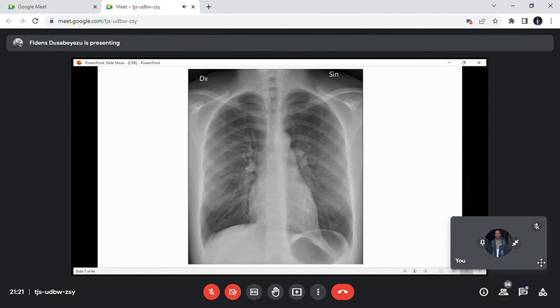So those are what we look at in the lungs. You have to think twice. The lungs are composed of this and this and this, and I can see this opacity. So this may be interstitial disease, maybe miliary TB; or apparently it is accumulation of fluid in the alveoli, most likely pneumonia or consolidation. That's how you think, you analyze the lungs.